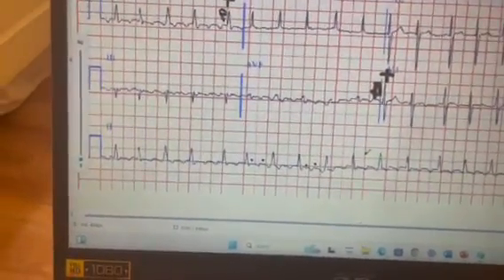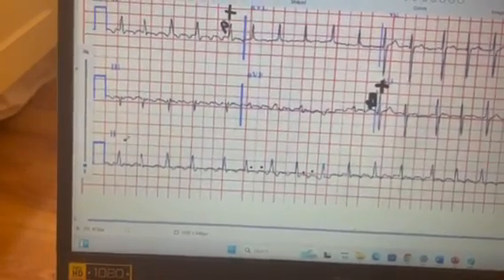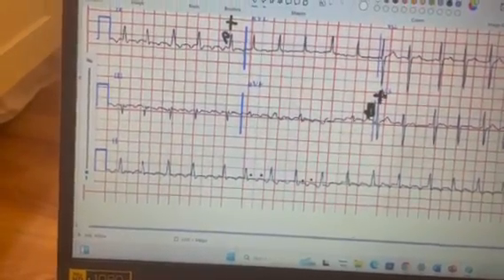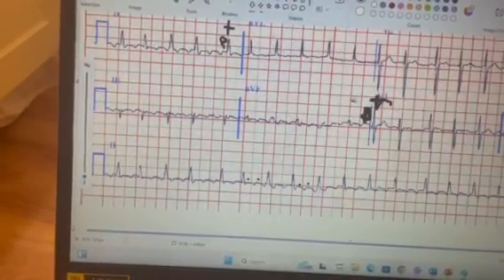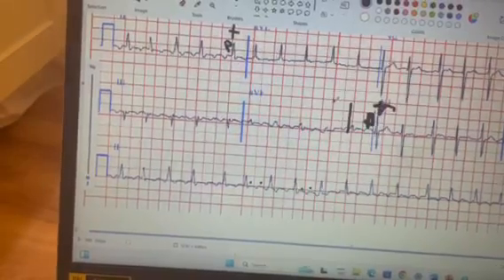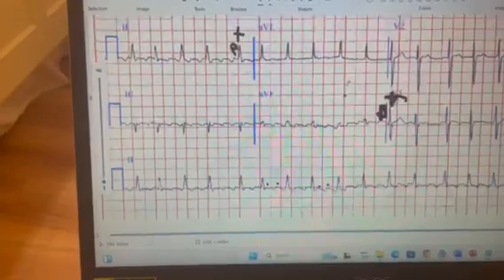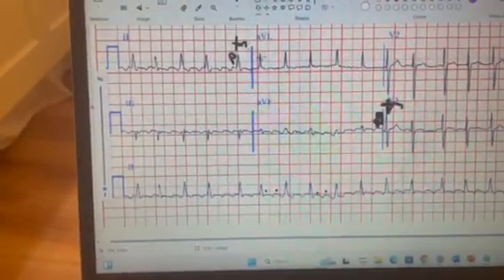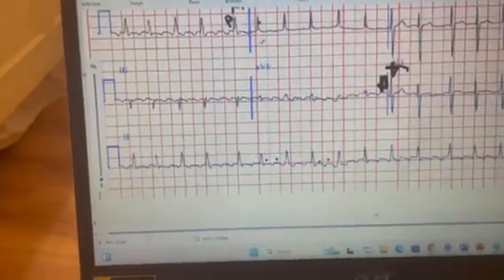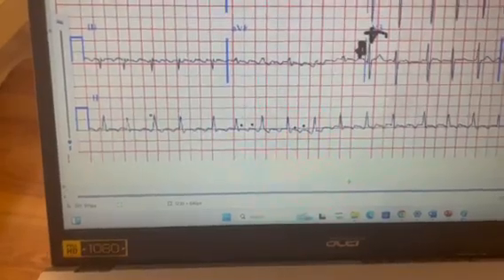What we can count, however, is the ventricular heart rate, which is these spikes, these R waves. Did I say T? I meant R. I get my T's and my R's confused sometimes. It's supposed to be P wave and R wave. We can count those pretty easily because they're uniform.